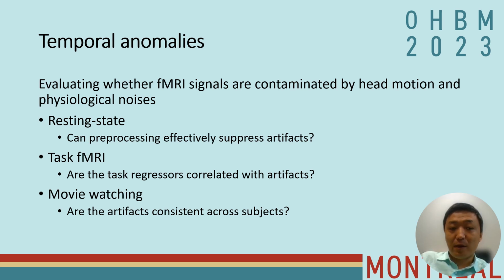For task-based fMRI, usually we have a task design, and we want to study whether those brain signals are correlated with the task design. Therefore, we want to check whether the head motion or physiological noises are also correlated with the task design, which is not desirable.